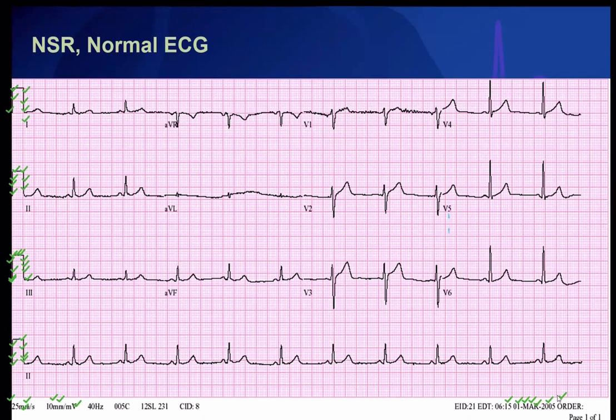It is also important to see if the ECG was done at the time of chest pain or not. So always check whether chest pain is present or absent when you interpret any ECG. That is very important for us.